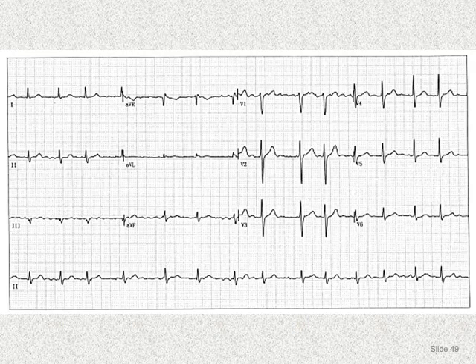We get 6 seconds, 2, 3, 4, 5, 6. So calculate here 1, 2, 3, 4, 5, 6, 7, 8, 9. So this is atrial fibrillation at a rate of 90. Complete the report. Yes, we will complete it.